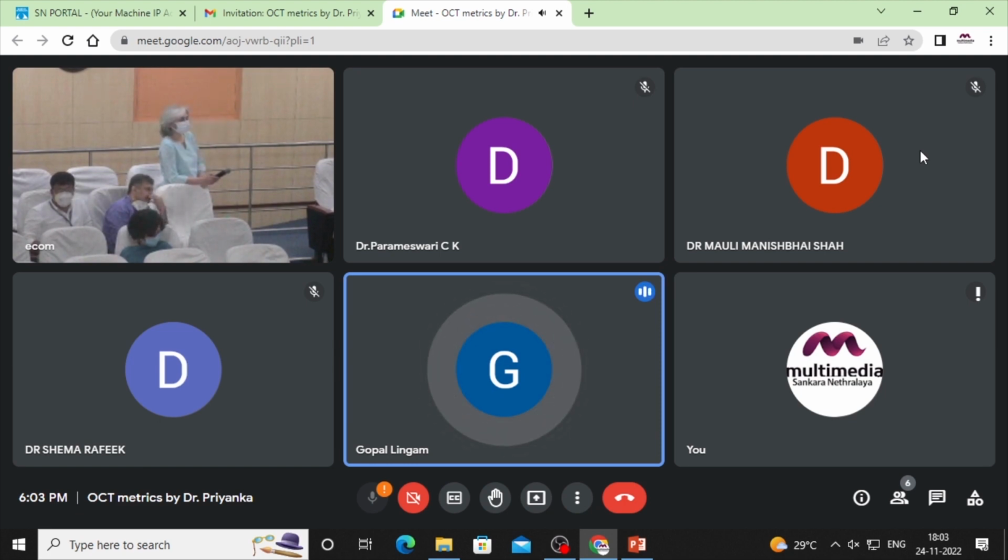Sometimes the company doesn't specify, but the Spectralis, for example, is supposed to measure from the ILM till Bruch's membrane, not the inner layer of the RPE, while Cirrus is supposed to measure from the ILM till the interdigitations of the cones to the pigment epithelium. That is the reason you get different values, not necessarily because of algorithms or software being different. I'm sure the software is adjusted to these values, but it's more because the reference line itself is different.